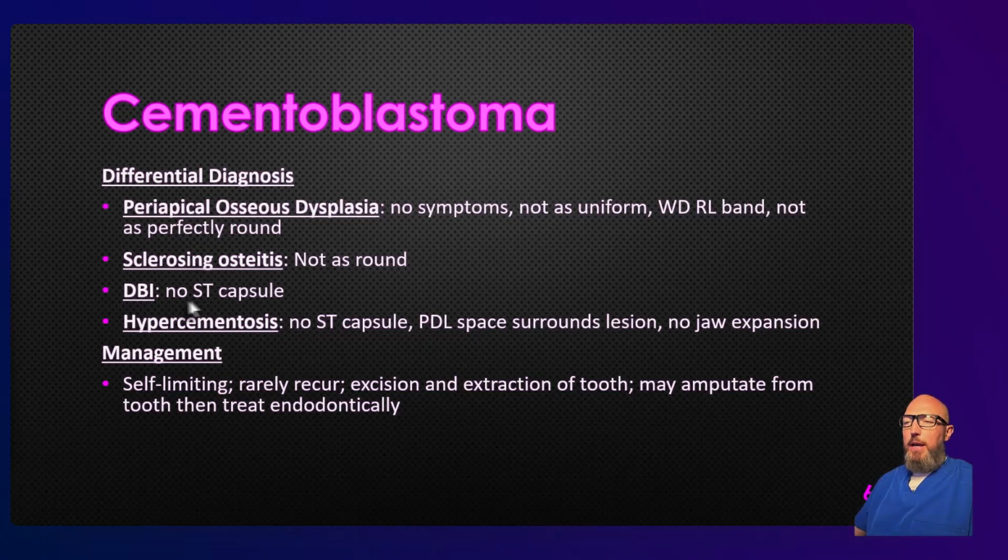No. Dense bone island doesn't have any radiolucency to it. Hypercementosis, we've talked about. The big thing there is it's a PDL space surrounding hypercementosis, so it's nice and thin and uniform. A little bit thicker radiolucency on cementoblastoma. And these don't expand like a cementoblastoma will. No pain with hypercementosis in most cases.